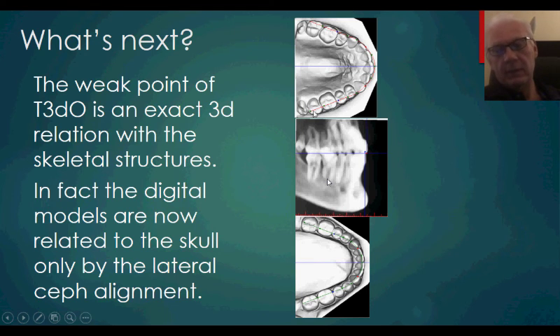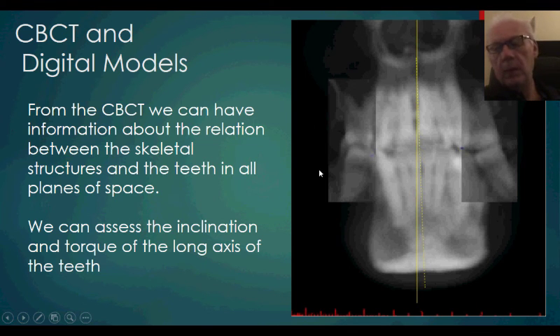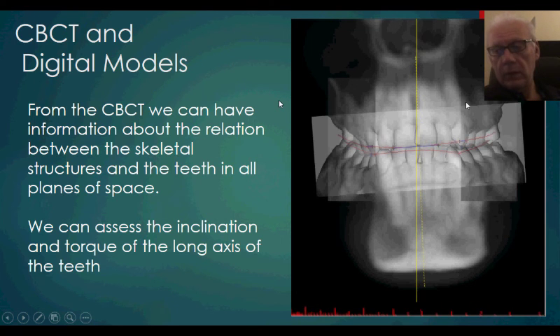As we were connecting the lateral view to the occlusogram, we will need also to connect the front teeth, or maybe different layers of the front view, to the digital models. So in this way, as you see here in this image, we can have a true reference for the height of the posterior areas.